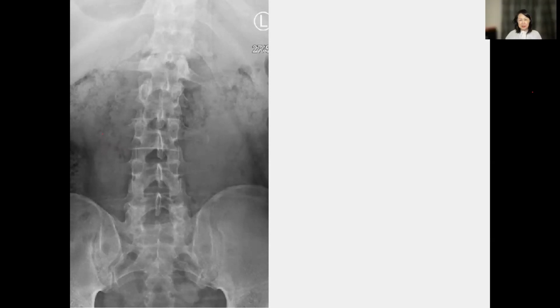Lee said SBO, small bowel obstruction. No. With small bowel obstruction, you will see dilated bowel loops at the center, but there are none here. Anyone else? Review area. Fecal loaded, correct, but it's not pathology. All of these are fecal loaded large bowel, not dilated. Calcified pancreas? No, there's no calcification here.